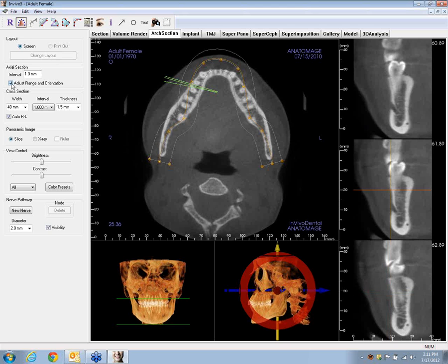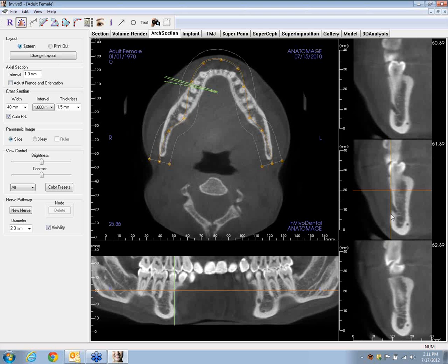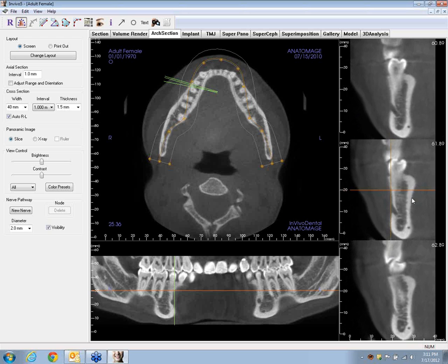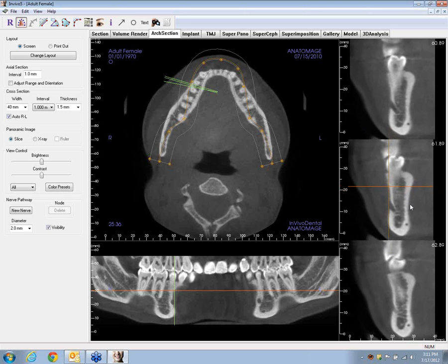As I uncheck that box now, I can also push down my control key and click and drag to make things bigger and smaller. Remember that from the basics. Or shift to move things in space here. And also do it with that adjustment screen that I just had up.